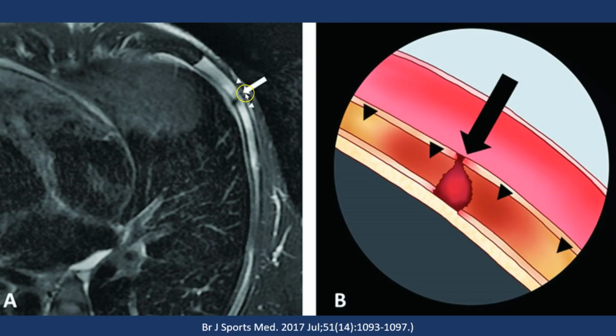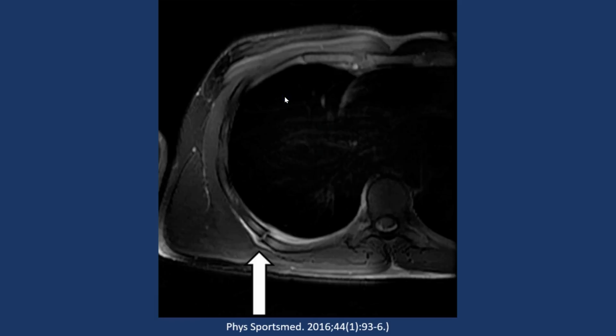On MRI, you'll see a fracture line. Usually it's low signal, sometimes it's high signal, surrounding hematoma on both surfaces, this bright stuff here, and edema within the bone. Some of this is artifact, not all of this is edema in the patient's bone. Nice example again of a stress fracture. Fracture line, offset in the cortex, a little bit of callus formation, and then edema surrounding the region of fracture.